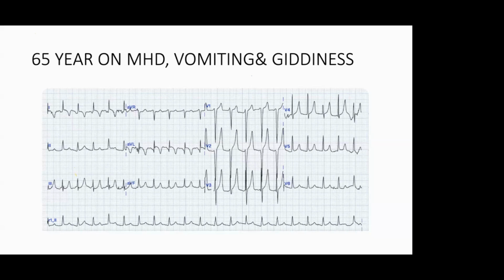Then reciprocal depression you can see because of the depolarization abnormality, not mainly because of the T wave. The QRS duration and S wave, those things I used to tell: Q wave followed by loss of QRS height, S wave pulled up, dome shaped ST elevation, then broad and tall T wave. These are the early features you see in MI, but none of the features are seen in this ECG. There are some ST depressions we are seeing, but the T waves are higher than the QRS, where we are seeing those changes. So with the history, it's more of a hyperkalemia. It's not a myocardial infarction.